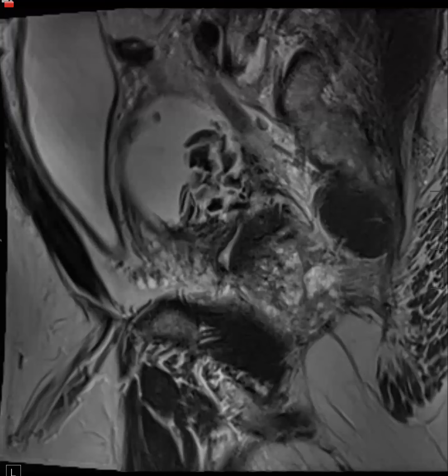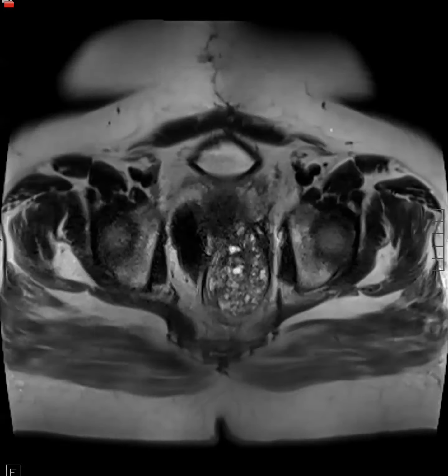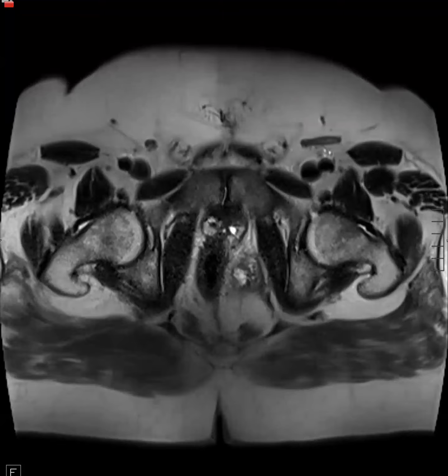That was a hard study because there's no IV contrast, so you're going off of a non-con study. Can you show on the MR if you have any axial T2 and post contrast? Yeah, here's the axial T2, to show the relationship with the prostate. The prostate is here.